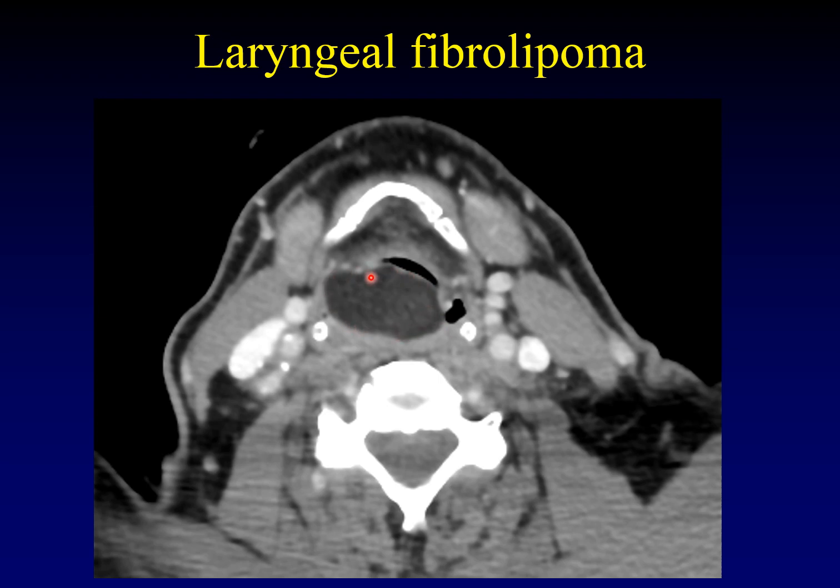Now, if you want to be a little concerned that this is a low-grade liposarcoma, that's reasonable in this case, but it's a very well-defined tumor. Don't forget about the alternative of fibrolipoma.